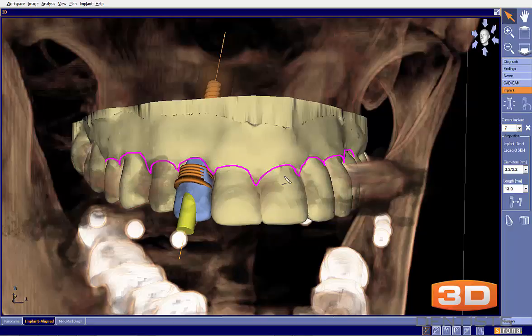If I drew a straight line from here across, I would see that my gingival margin on site number 7 is about a millimeter longer, or maybe a hair longer, than on the contralateral tooth number 10, and certainly longer than teeth number 8 and 9. The reason that's important is that it affects our apical placement of the implant, so we want to determine that.